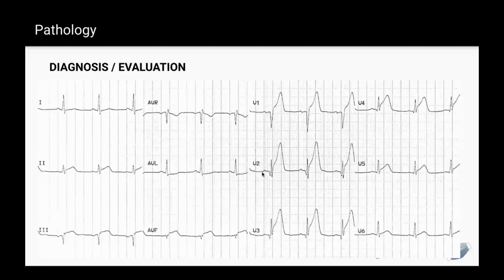Now, we talked about ST elevations. Does anyone want to take a gander at which leads? These are V's, by the way, not U's. If anybody wants to take a gander at which of the leads are showing ST elevations.